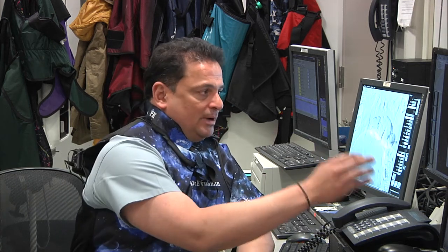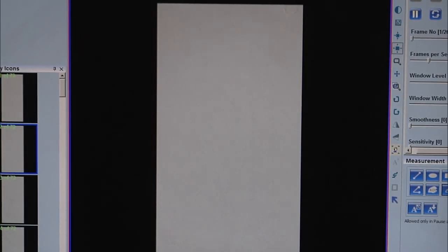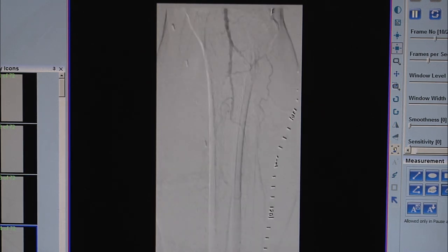So those of you who remember, angiographically, I'm just going to go over the film very quickly, as this is going to be spliced onto the last case. You can see here the 2 failed bypass grafts, behind which is the SFA. You can see the superficial femoral artery with a covered stent that was done prior to this procedure, and the Zilver PTX all the way down here, which is the distal popliteal.